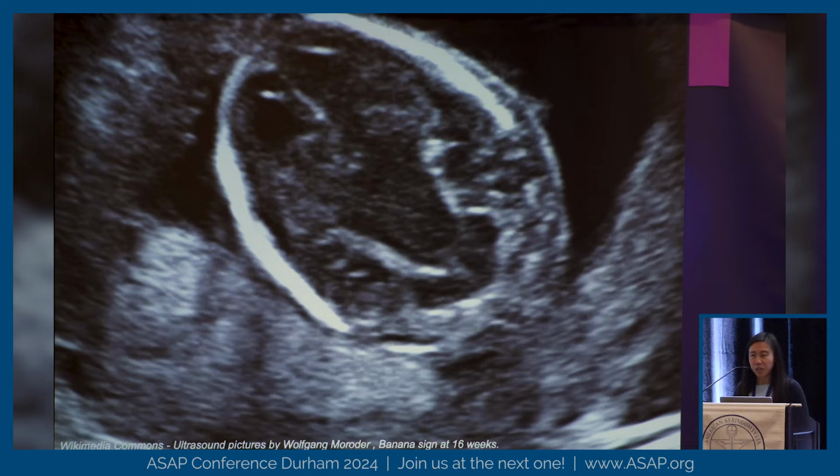I'm not going to be going through ultrasound for the rest of the talk because that's hard to grasp in 25 minutes. But this is an ultrasound image of a fetus. And for some of the participants who've had babies out there, you may recognize a little bit of this. This is the placenta in the mom. This is the amniotic fluid. You guys can see my arrows, right?